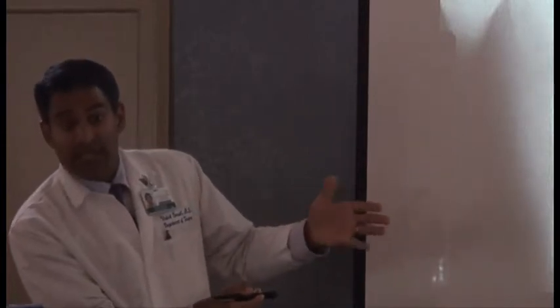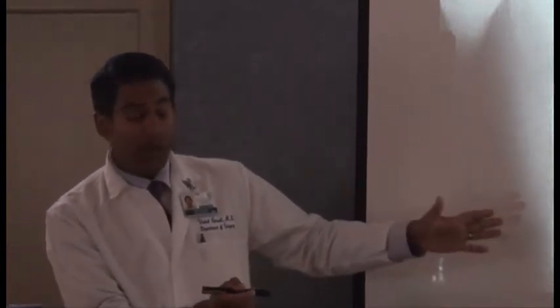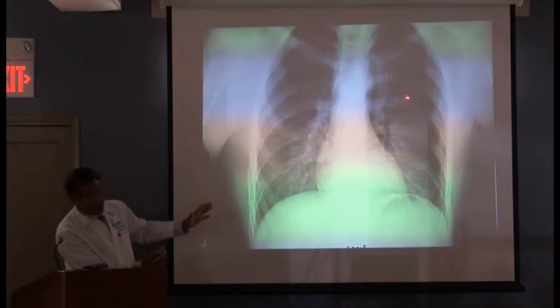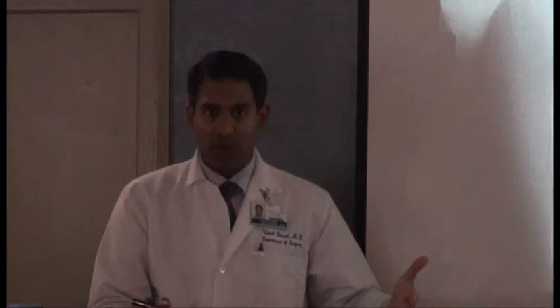There's air. That's right. It's air that's outside of the lung. All right, because here the lung ends, because all these white stripes end right here. So see this line? Everyone see that line? Yeah. All right, and then you see air back here. That's a pneumothorax. All right.